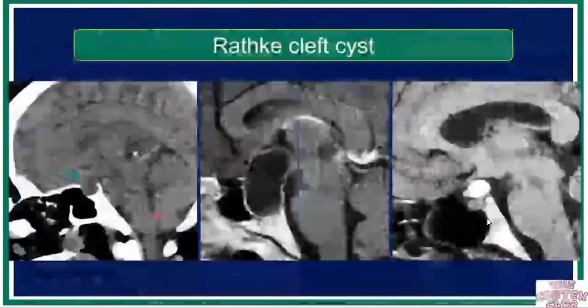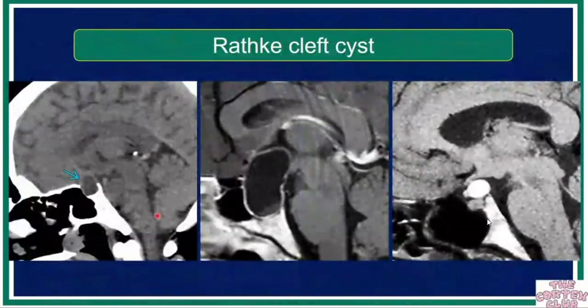All right. And this is what I was talking about, Rathke's cleft cysts. Usually they are cystic, they are hypodense on CT, as we can see here. They are homogeneous. They usually do not enhance, and you can see stretched pituitary gland around the Rathke's cleft cyst. But sometimes they can appear hyperintense on T1 weighted images, and that is because of their high protein or mucoid content. But usually they are homogeneous. They don't have that heterogeneous appearance that is usually common with hemorrhagic macroadenomas or apoplexy.